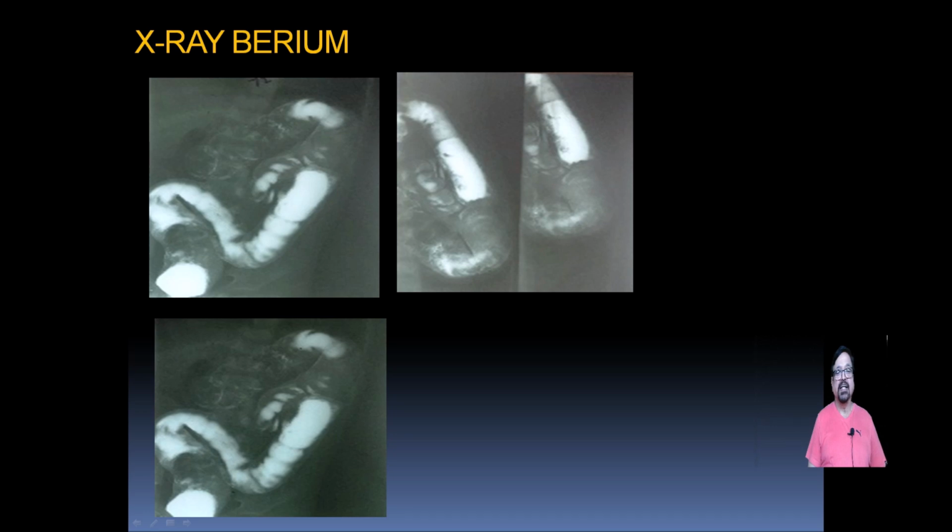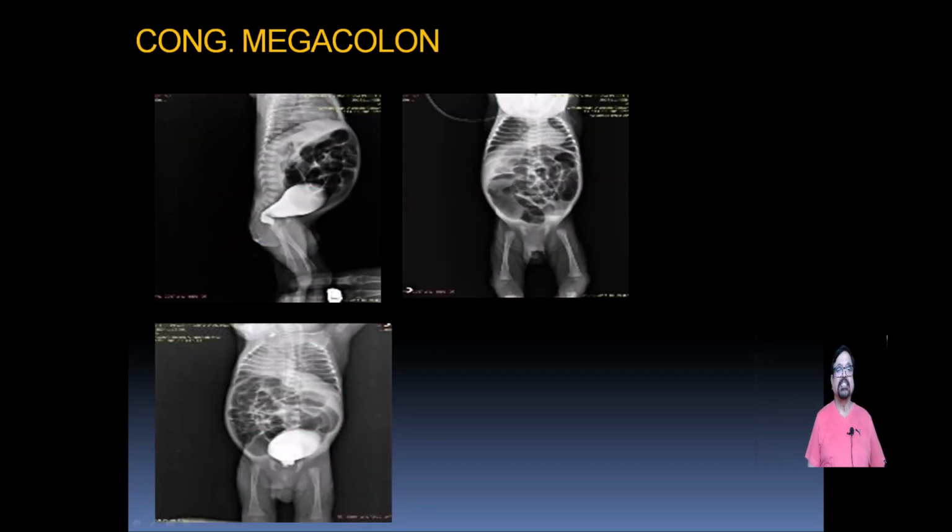Here there are few more pictures which you must diagnose. We have seen this pathology. This is intussusception. Now, there is an application in large bowel pathologies involving anorectal malformations. In that, top on the list is congenital megacolon. Now we are going to see multiple cases where there will be a narrow segment at the anorectal junction. It could be an ultra short segment, it could be a short segment, or it could be a long segment. Now we are going to quickly run over the series since the pathologies are self-evident.